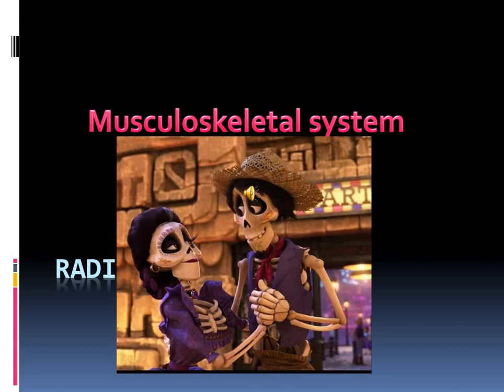I tried to simplify the slides, and we will start with some slides on anatomy for refreshment of your knowledge about the anatomy of the bone, and later on we will try to discuss the pathology in titles which are very important, and try to reach the diagnosis as much as possible, because there are in fact many entities in this system. So please try to concentrate on the image, on the main description for each lesion, and we will discuss any things later on.